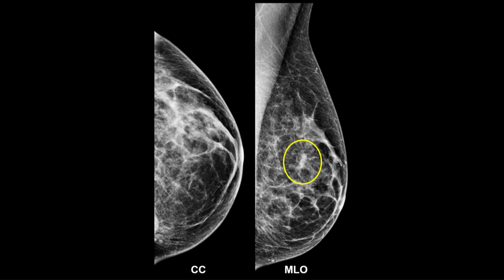Well, the other alternative is you do see something at ultrasound. And what you see at ultrasound may well be a cancer. But it also may not be the finding that you saw at mammo. Because the misregistration between mammo and ultrasound is at least 10%. So you still have to work up that one-view finding, even if you found something at ultrasound, because it may just be something that's adjacent. And the ultrasound finding may be benign, and the one-view asymmetry may be a cancer.